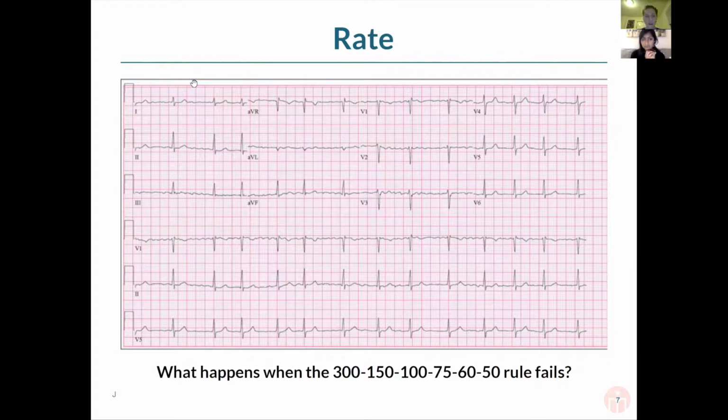A little confusing again, because we don't see the tick marks on this particular one, but an actual EKG that you would have in front of you would have that. Or if for some reason we're going to test you on that, obviously that would be there. But that's another way that you can go about doing it, is to actually just count how many RR complexes or QRS complexes come between those two tick marks, which will be 6 seconds, and then multiply by 10, that'll give you an average. So that's another way to do it, which is actually probably the best way to check in a situation like this when you have AFib.